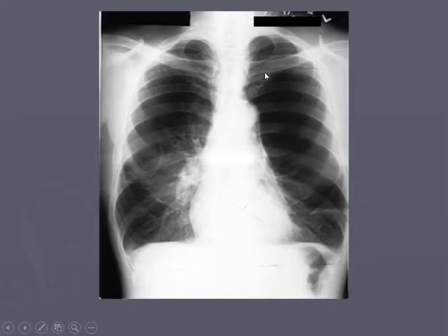And then fields, again, this is very dark. Remember, this sort of looks like that pneumothorax x-ray we saw earlier, where you had this just dropped lung and everything is pushing to the side. This is actually emphysema. So you see all these bullae, the lungs are just literally Swiss cheesed with air pockets, and his only functional part of the lung are basically these lower parts right there.